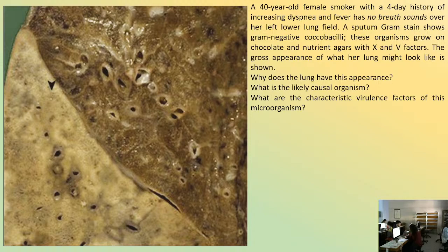So who can tell me what he thinks? Because you've seen the lung in anatomy, the normal lung. What's close to what you have seen? Yes. The upper is normal. Yes, and what are these spaces here? You see these lumen here. What are they? The airways. And which part of the airways? The bronchi. These are the bronchi, and we have the surrounding alveoli.